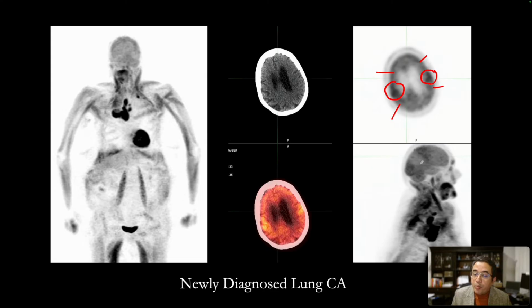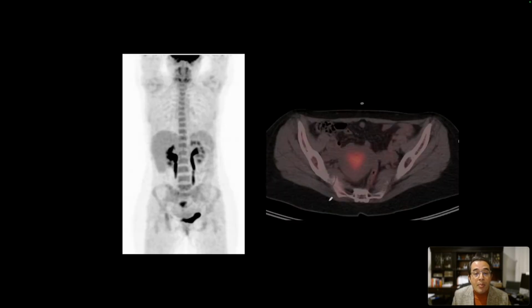And that finding is best seen here on this rotating image, but in a lateral projection, the extension of hypometabolism from the parietal to the temporal lobes. This whole strip is hypometabolic on both sides, and that's characteristic of Alzheimer's disease. And so frequently we pick up such things on PET CT studies when we are staging patients for cancer.